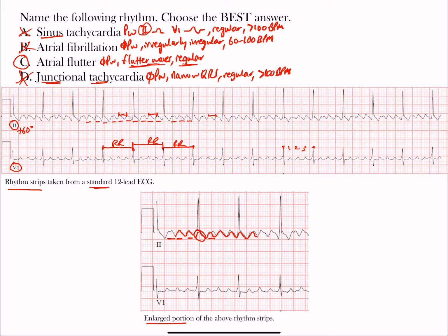Notice that this here does not look like these two that come before it. If you look up here, notice that this end portion looks a little different, and that's because it's being obscured by the T wave. So notice this portion here compared to these two look the same. And what you have hiding within this, not only is the T wave obscuring this, but the QRS complex is obscuring another one.